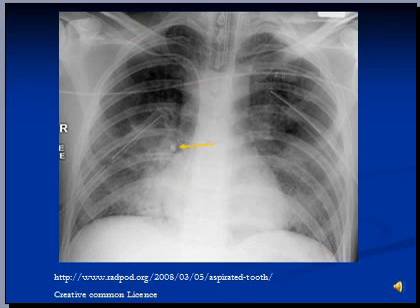There is a tooth as a foreign body in one of the bronchial branches on right side, which is indicated by yellow arrow, and can be pulled out using a bronchoscope. Teeth can often break away and end up in bronchi, sometimes during intubation. Other findings are consolidation in both mid and lower zones. Right heart border is not clearly visible, which is also known as positive silhouette sign.